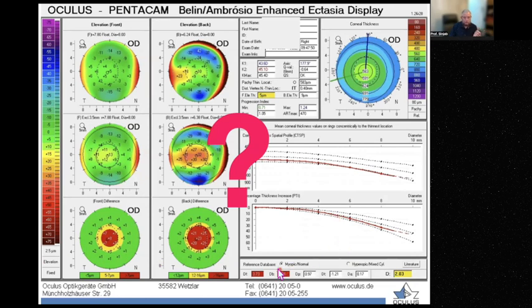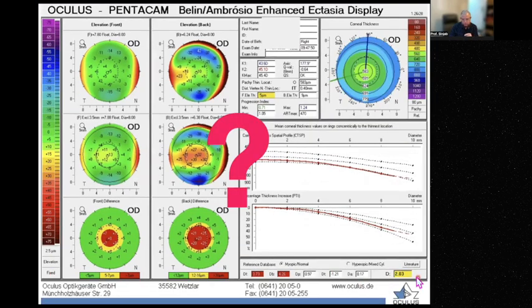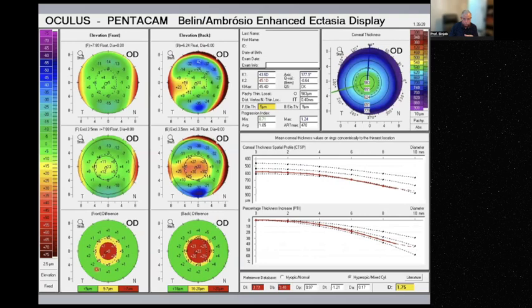Now look at this. This is the myopic. Now I'm going to click the hyperopic one, as you see here. The hyperopic. Now the numbers became less. The final D is 1.75, while it was 2.03. So it is less abnormal, but still abnormal. So always be careful to choose the correct one.